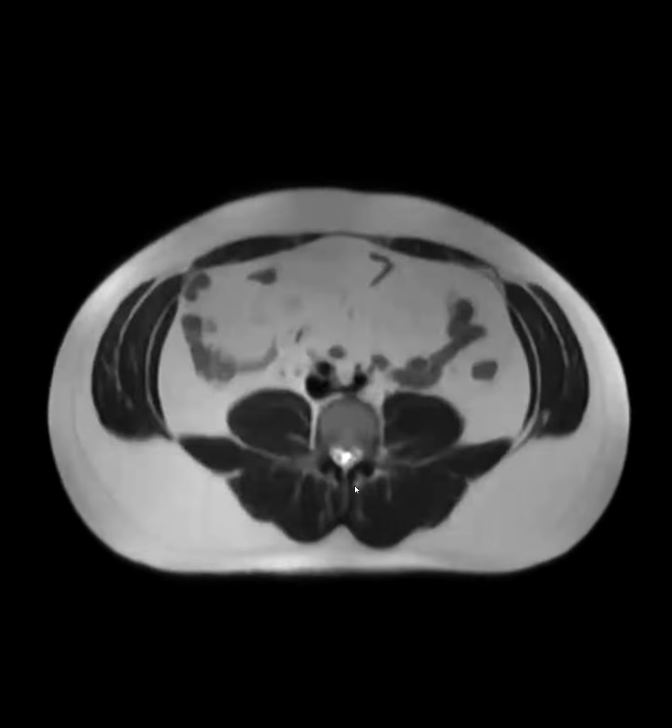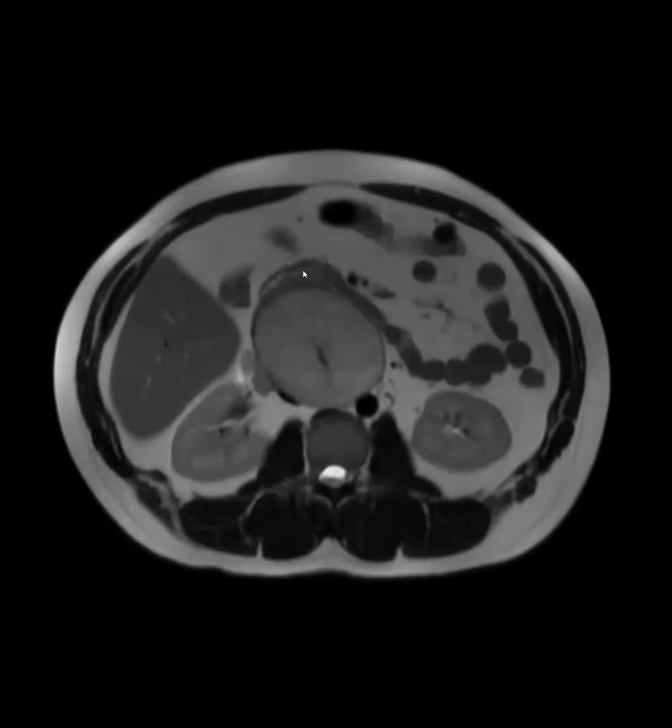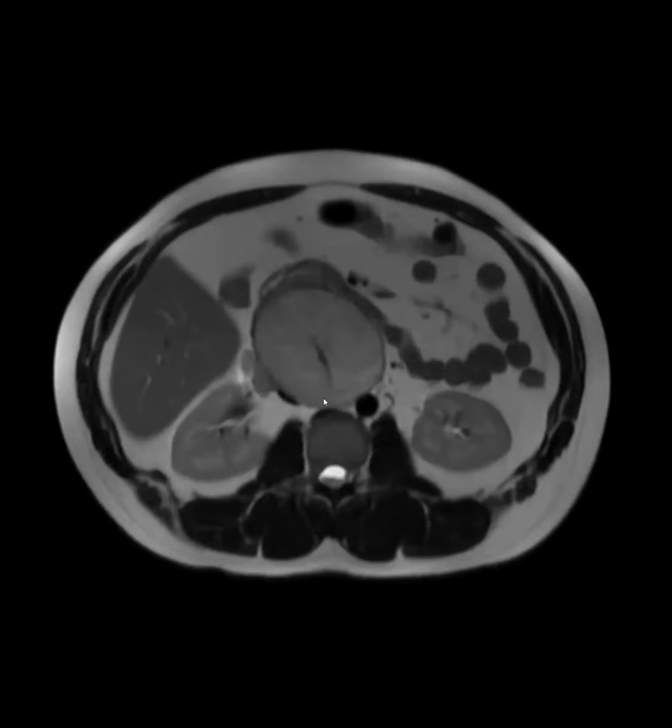And you thought it was non-seminomatous because it was non-enhancing, like an embryonal tumor? Yeah, I was a little bit spacing out earlier. For example, we talk about burnt out germ cell tumors, which burn out in the scrotum, but then there's a mass. So I thought maybe this is the opposite, where the retroperitoneal tumor burnt out and outgrew its blood supply.